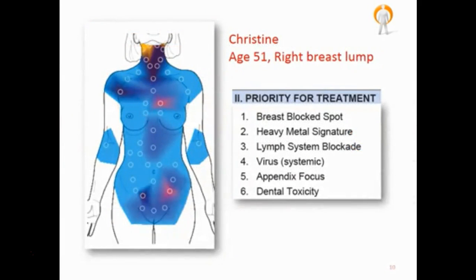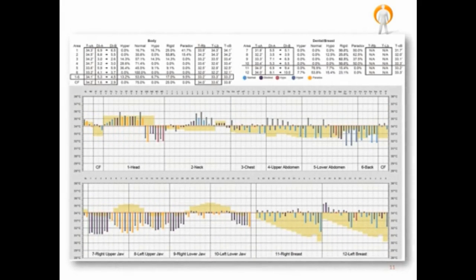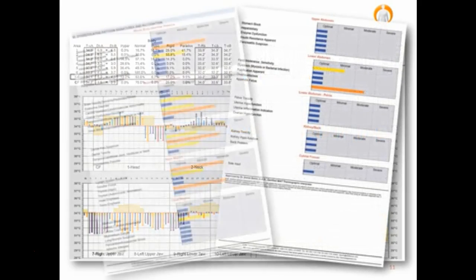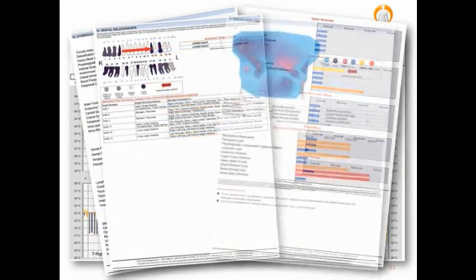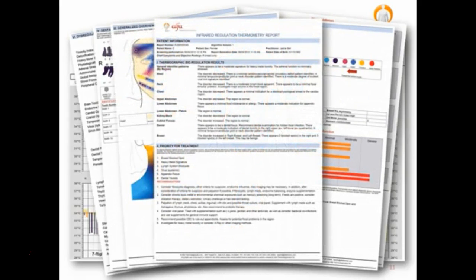So it's understanding this whole body integrated perspective of the physiology that will give you the edge in determining the best course of action and treatment strategy for your patient. Even though all the information from the last page of tables and graph data has been translated for you into images and descriptions throughout the whole report, we're going to start by learning the components of the graph, and from there we'll go over each section of the AlphaView report.